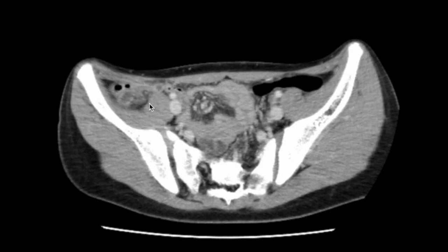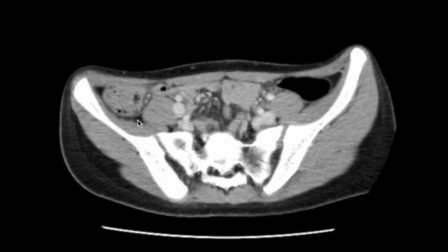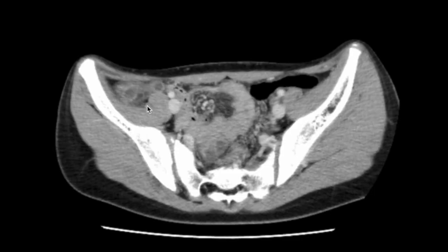Now look at the surroundings. The fat around the appendix has a fluffy white stranding. Normally, this is an area of visceral fat that appears jet black on CT, but around the appendix it looks grayish. That happens because inflammatory exudate, essentially water, accumulates, and because blood flow increases to deliver cells needed for tissue repair and to fight the invading bacteria. This makes the fat look whiter and more conspicuous.